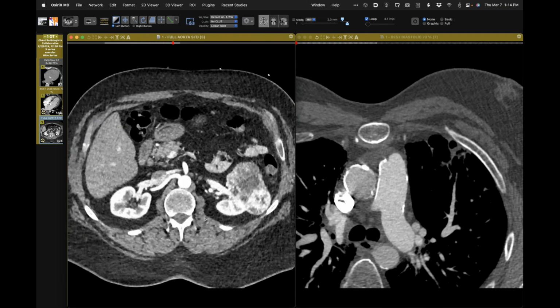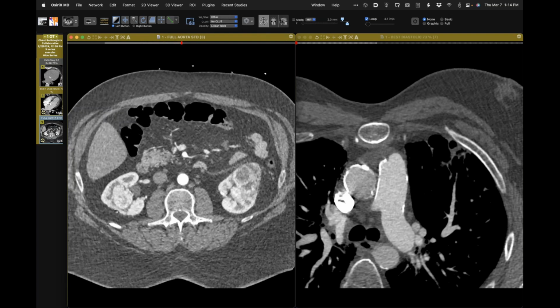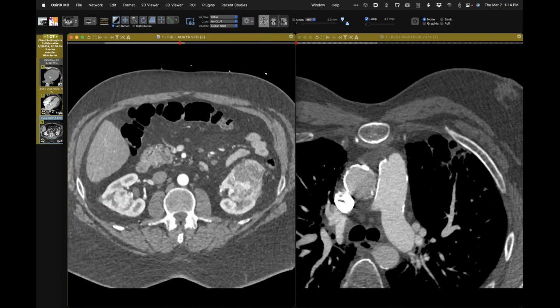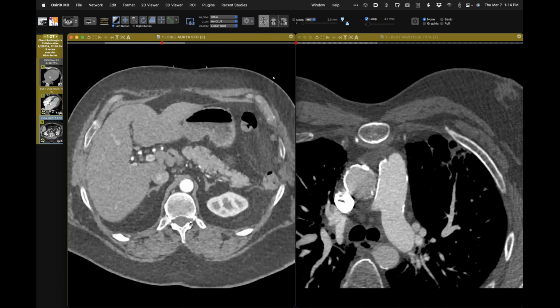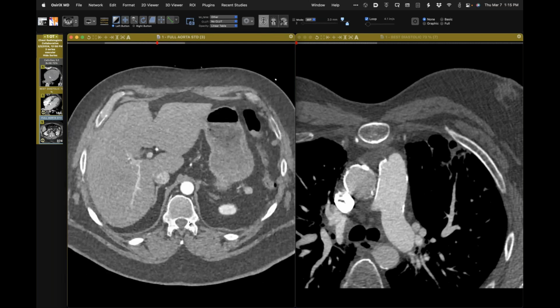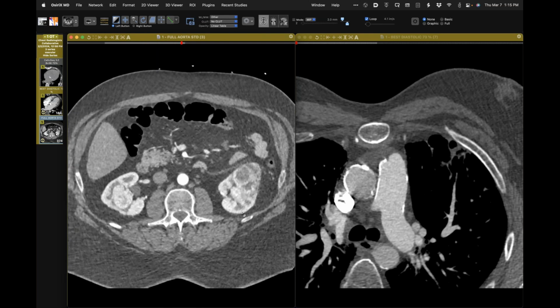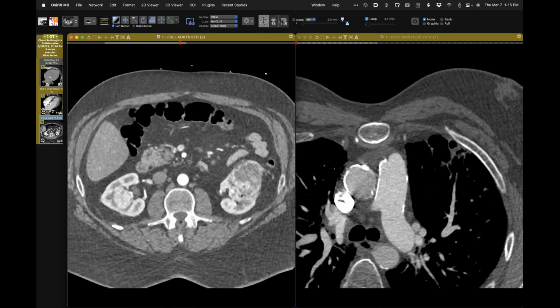Oh, yes. Right. That might be a thing there too. Bilateral. I forgot to mention that. Bilateral. Yeah, look at that. Oh my goodness. Yeah, this person had a lot of surprises. Absolutely. I did not think about or notice the absence of the spleen. Very good. Oh, look at that. Yeah, I remember that now. We did see that. That was a surprise too. So a bunch of surprises.